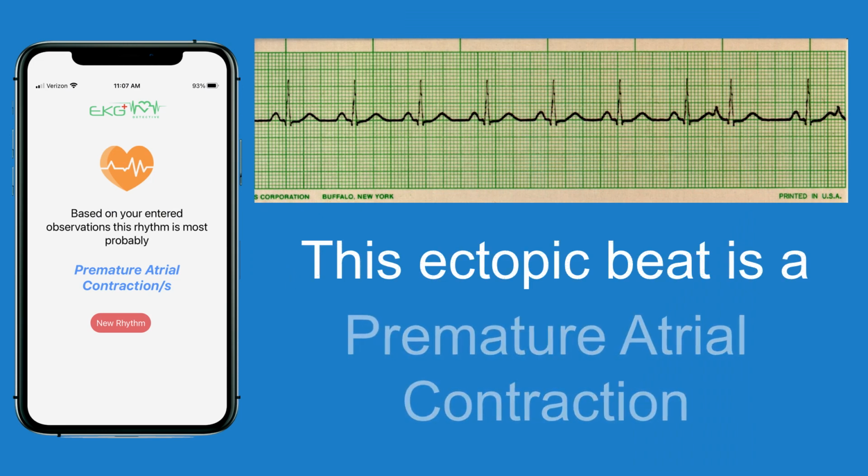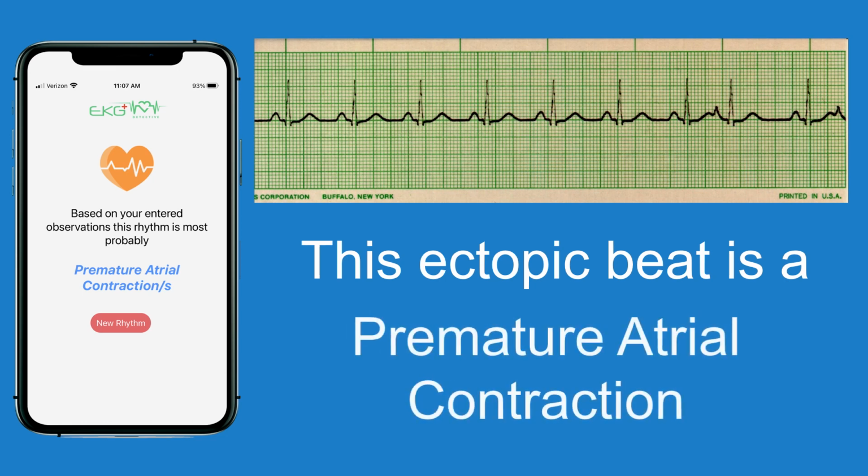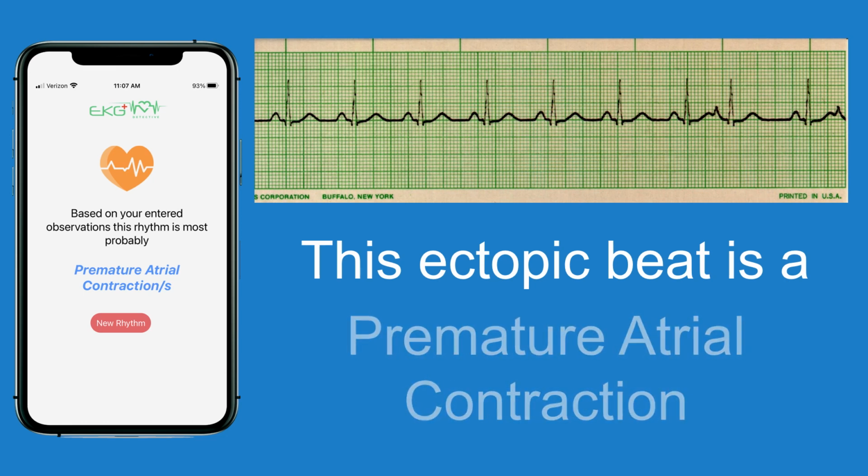And referring back to our app, once we select the PR interval, the app is going to tell us that we have a premature atrial contraction that we've been working with from the very beginning.